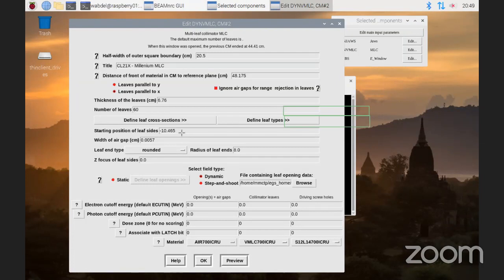This value is not there, so I had to manually play with it until I could match one edge, using this 10 by 10 geometry to match the jaws. I can change this value, let's say to -10, I can put it at -9, and you will see that both profiles are completely off. Although in MMCTP, it looks fine because you don't have that issue.